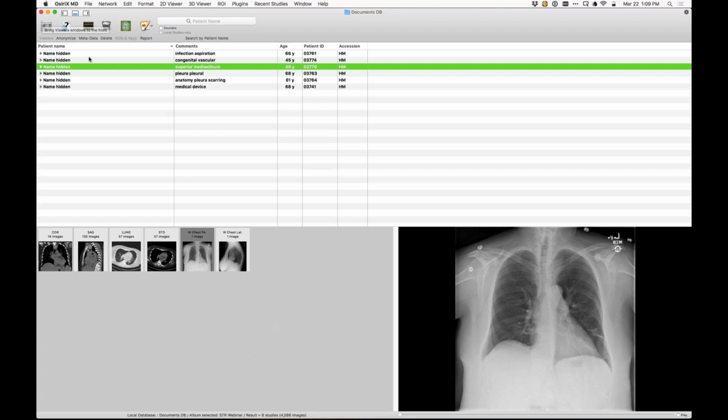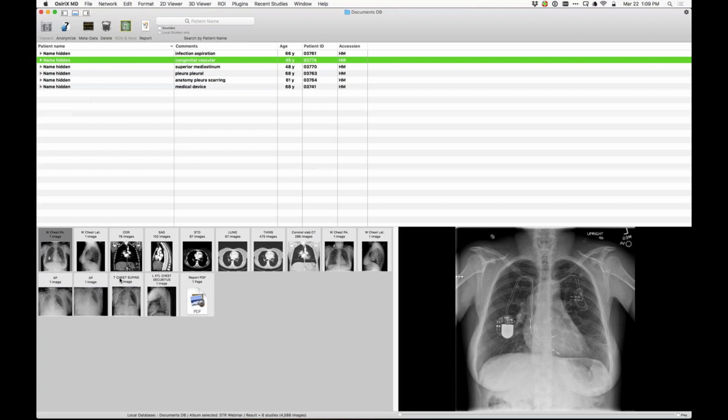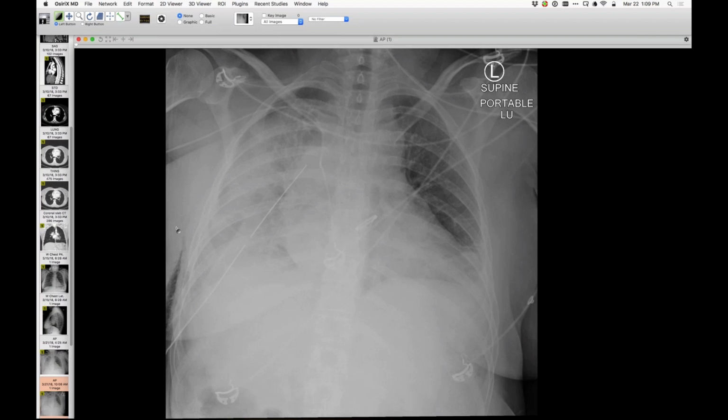Okay, here is a case that, depending on when you saw this patient, things would evolve differently. The finding came to attention recently on the basis of a catheter placement. So here we see a catheter. There are other lesions related to the chest. The person has had surgery. There was a complication, so the chest tube and the pleural fluid are not related to the observation of the catheter. So that's a good observation.